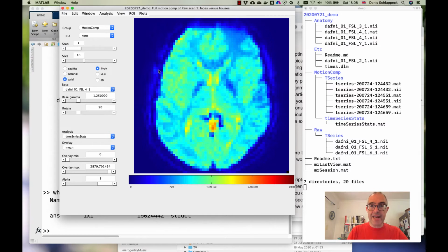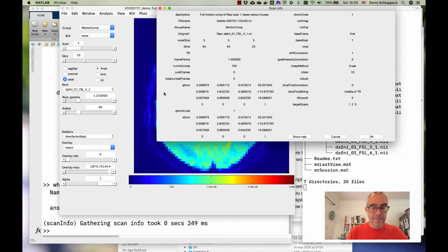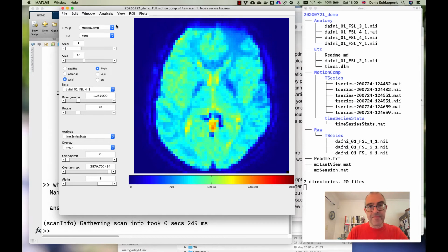So for example, if you edit some aspect of the data here, say you edit some information of the scan. Actually, this doesn't have an edit window, but you can change file names and so on. This would be using the view_set function to change the data and save that out. If it also requires changing some aspect of the raw data files, that might also happen with these functions.